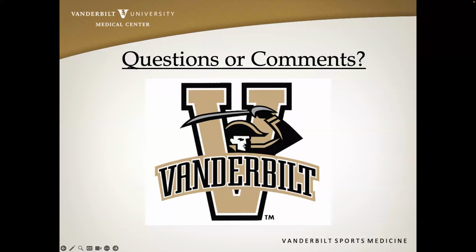And then lastly, in this case, we did use color Doppler. We did not see any hyperemia or vascularity, which can sometimes be variable in these apophysitis cases, but I still think it's important to take a look. And obviously, you had mentioned dynamic imaging, if you are concerned about any type of tendon tearing, just because a lot of the time that can make those tendon tears a little more apparent on examination, and also makes sure that the extensor mechanism is intact. So those are just a few of the points to highlight from the talk.